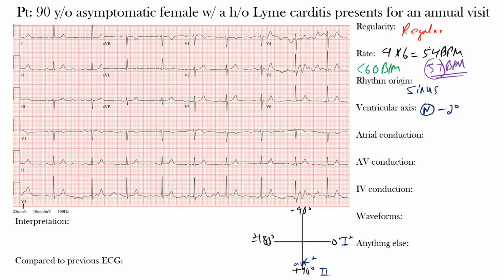Okay, so what we want to have, and remember the normal ventricular axis, we talked about the P wave axis earlier between 0 and positive 75 degrees. The normal QRS axis is between -30 degrees, which is about here, to about positive 105 degrees or positive 110. Within this whole range here is considered normal axis. Okay, this area to the right of it, this is what we call rightward axis deviation. This would be leftward axis deviation and more pathologic. This area here would be more that physiologic that we'll talk about. And then this is more extreme axis deviation, okay, or northwest axis or no man's land you may have heard of.